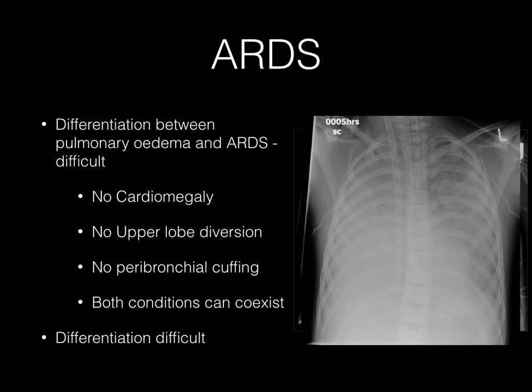Now, when you're describing a chest X-ray of a patient with bilateral lung infiltrates, I will go back to the previous slide, and maybe we could describe this particular chest X-ray. What we can basically say is that there is bilateral four quadrant infiltrate which is confluent, and there appears to be bilateral whiteout of both hemithoraces, right more than the left. The cardiac shadow is poorly visualized due to the surrounding pulmonary infiltrates.